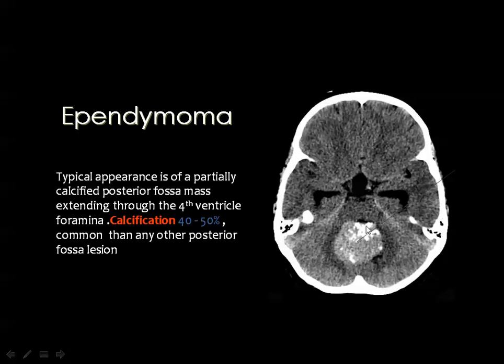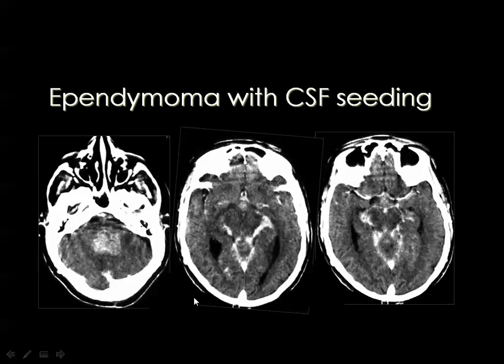Then this is a tumor which is classic for ependymoma. It's a midline posterior fossa lesion centered on the region of the fourth ventricle. It shows homogeneous post-contrast enhancement with multiple areas of matrix calcification, as you can see. Calcium is very common in this particular type of tumor. It may occur in about 40 to 50% of the lesions. The tumor is obstructing the fourth ventricle with consequent supratentorial hydrocephalic changes, as you can see in the dilatation of the temporal horns of the lateral ventricles.